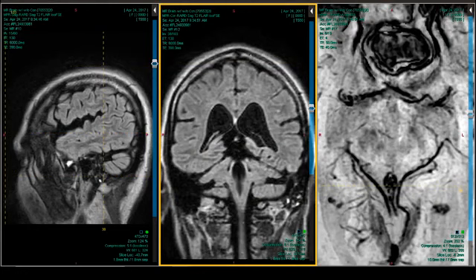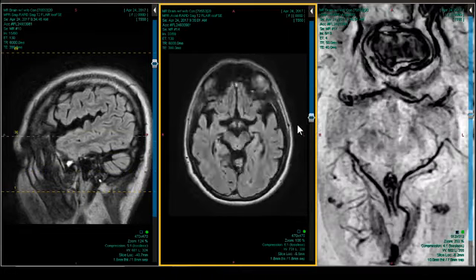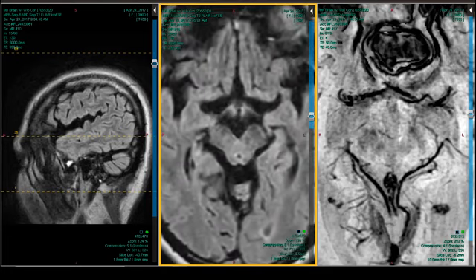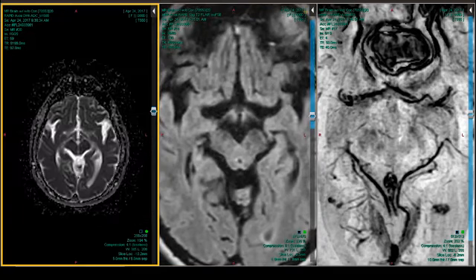And I'm going to put up the axial FLAIR to go with it, right at that spot, and then let Dr. Shupek take over. And I'm going to make that one bigger. And let's put up the axial T2 while we're at it, and make that one bigger too. I think there is a T2 right here.